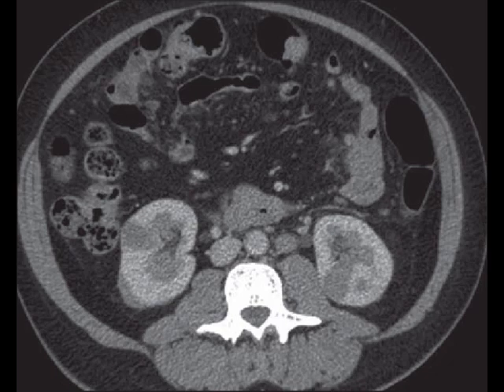On the left is the second pattern of lymphoma in a kidney, which is a solitary mass. Solitary mass occurs in around 10%. Again, it looks the same, so hypovascular, homogeneously hypoattenuating, non-enhancing within an otherwise normally enhancing kidney.